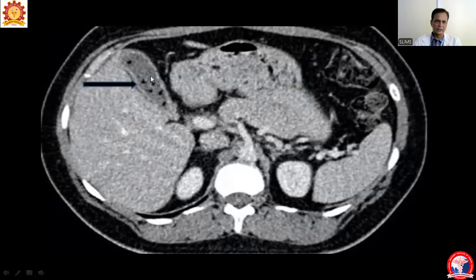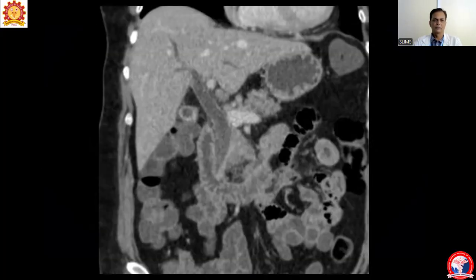This is again a CT scan image, but here what we are seeing is purely hypodense cholesterol calculi, non-calcified. Cholesterol being a fat, is seen as hypodense areas within. This is again a very important additional thing we will discuss here.